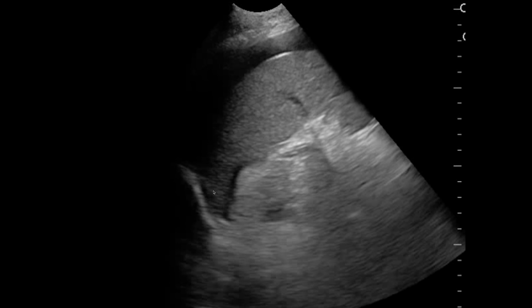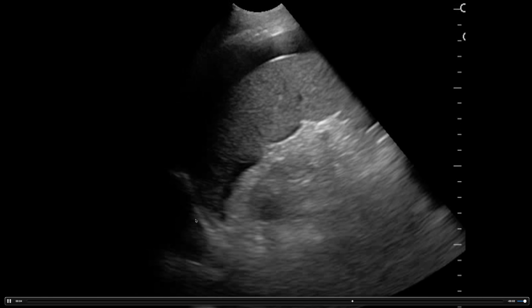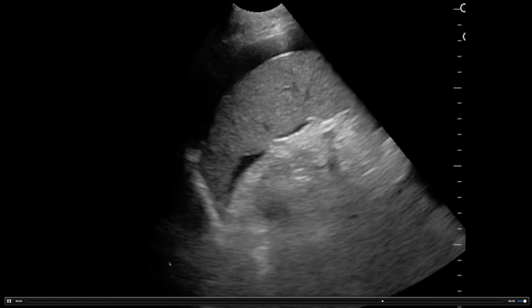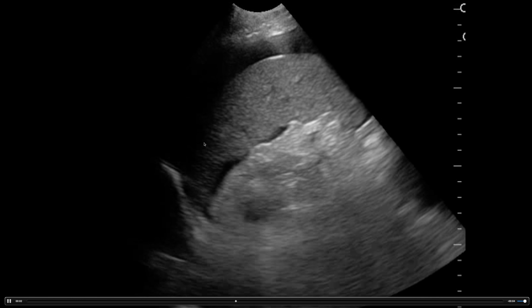scary as well. So you have spleen here sitting in a bath of fluid. If you're also careful to notice, look above the diaphragm here, there's also anechoic material and what looks like the spine down here. So this patient has fluid above and below the diaphragm.